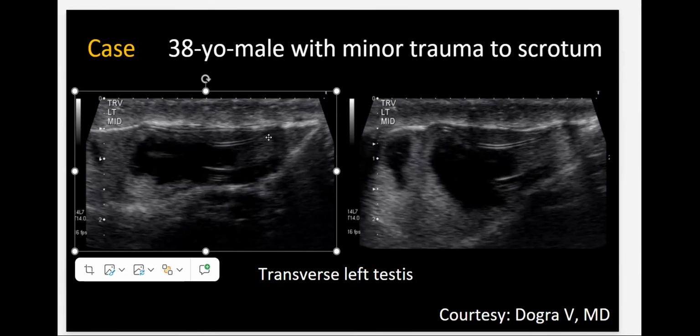There's two curvilinear echogenic lines. It's like iatrogenic. Say if it was in the breast, what would you think of? Like a silicone capsule. Yeah, ruptured breast implant. So is this a ruptured testicular implant? Yes, ruptured testicular implant.